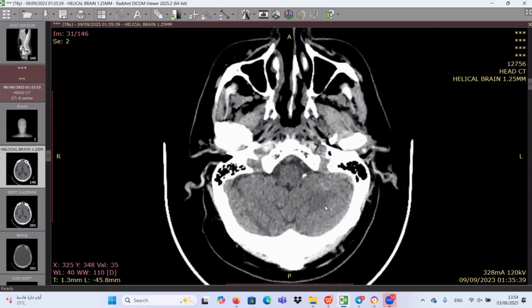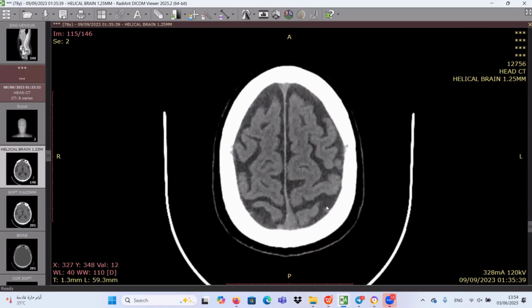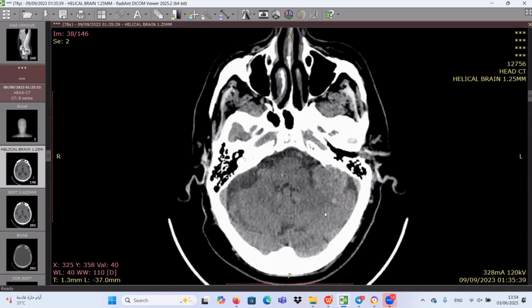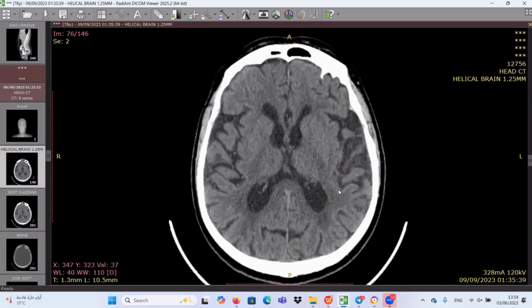This case, I think I reported this case 2 years ago, but it's an interesting case really. If you want to scroll, go on. I think can the doctor scroll for me, no problem. Okay. So I have here a CT abdomen, sorry, a CT head axial cut.